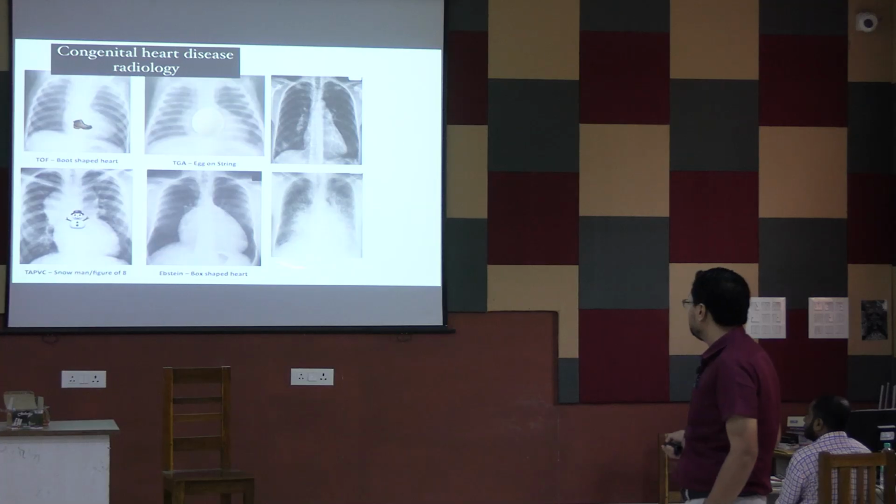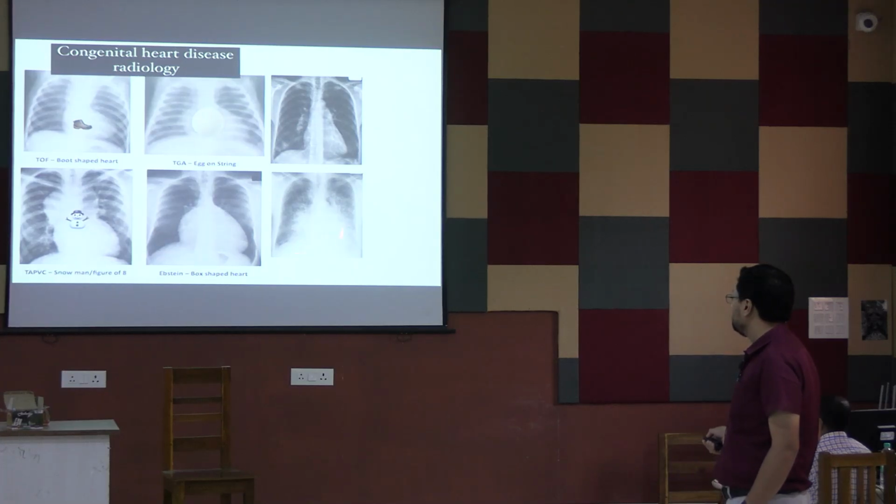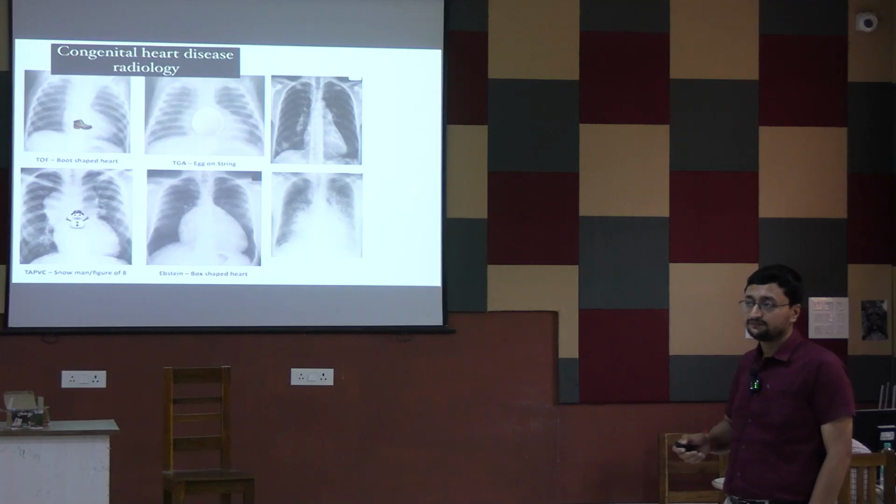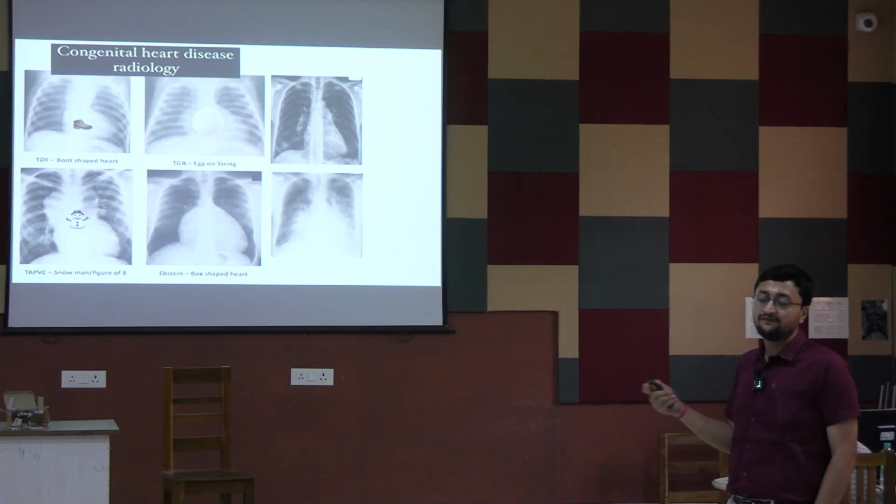this is important. What is this? This X-ray is very important. Very commonly you can find this type of X-ray in your IPD round or ICU round.